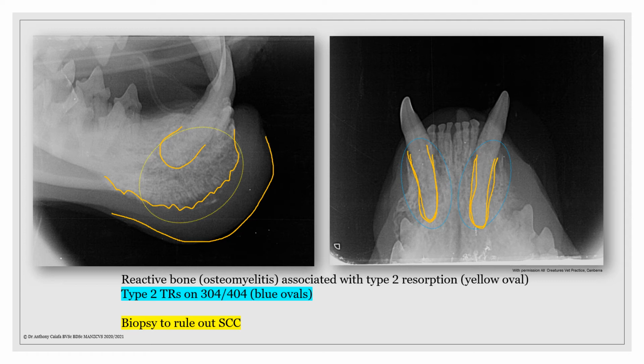And over a period of time, over a few months, the chin swelling and the bony reaction started to subside, and subsequent radiographs showed that this reaction was starting to diminish. So this was all reactive bone related to the tooth resorption.